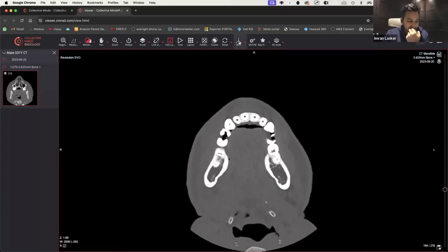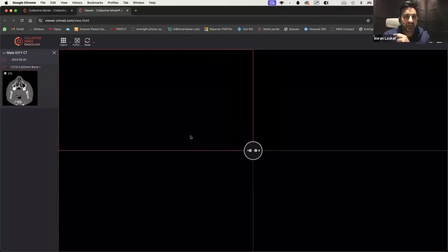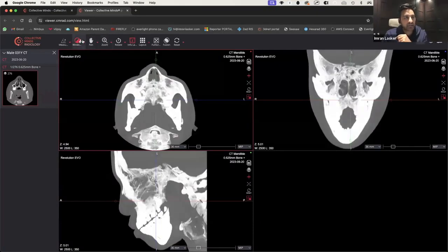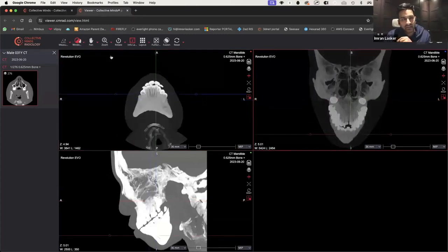Okay, so let's go for it. So someone's come out with this. So again, I'm going to try and show you guys. So let's do oblique, mystique oblique, whatever that's called. Let's MIP a bit and let's window a bit to try and make it look more like skull. Let's see what's going on. And then what we'll do, we'll just try and line things up a bit.